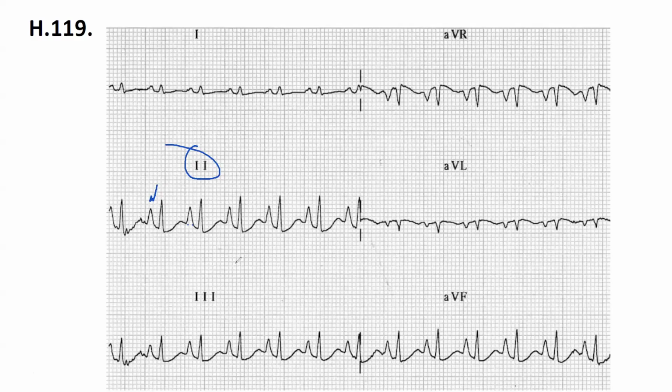It's really tall. It's not wide, because it's about 2.5 millimeters, so I don't think it is too wide. But it's tall.